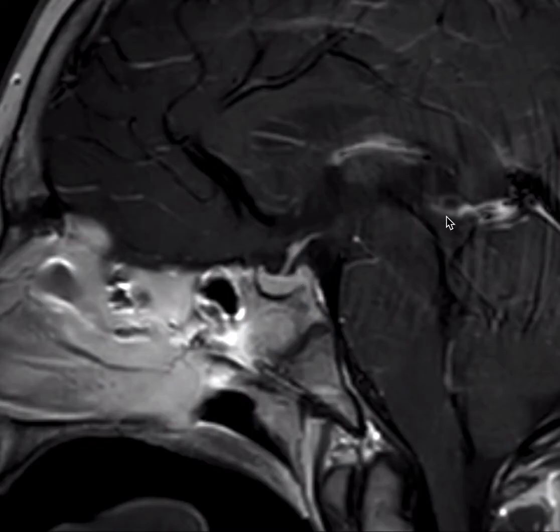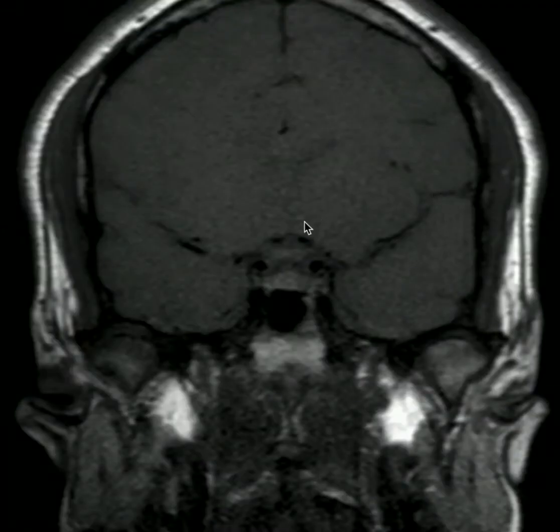We also see normal enhancement here of the pineal gland, and if we look into the nasopharyngeal area, the mucosal surfaces here are also expected to enhance. Let's now look at some dynamic imaging to get a better sense for how the pituitary gland changes with time as contrast fills it. Here we have a dynamic sequence that will allow us to look at progressive enhancement in the sellar region. We're starting at this more anterior coronal slice and are currently looking at the anterior pituitary seen here and the optic chiasm above it. We'll move forward at approximately 10-second intervals and look at how the gland enhances.